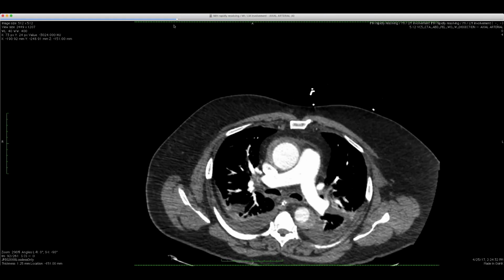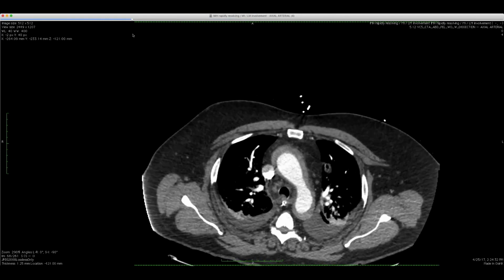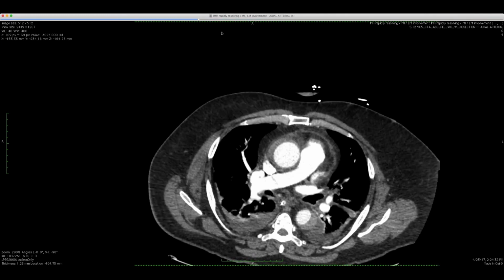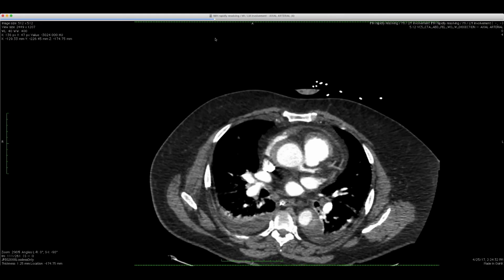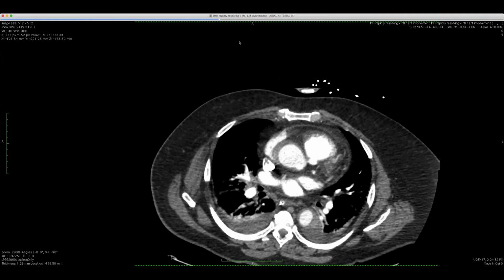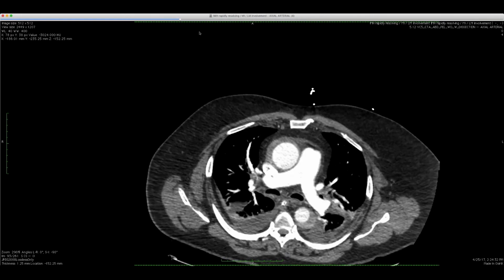And so overall, what do y'all think about this process? Because I've never seen this. If this is an IMH that's acute, I've never seen one change so quickly in just the course of a few hours. And there's an MI here too, where there was some left main involvement and now there's no visible involvement. Just very strange. This same thing was involving the renal arteries and resolved on this particular scan. Have you all seen that rapid change? What do you think about this?